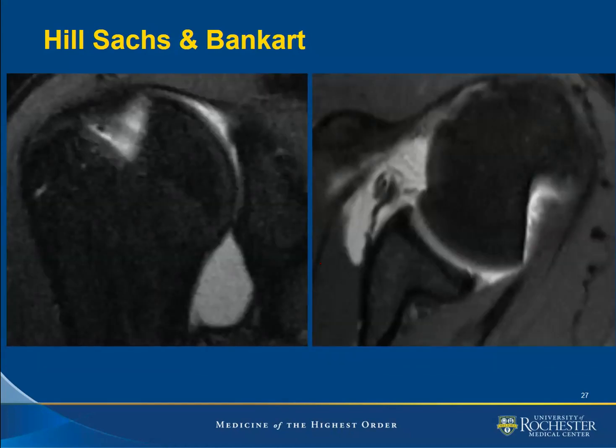Another case of a patient with a Hill-Sachs and Bankart abnormality, you can nicely see this on-track Hill-Sachs defect. And then when you get to that anterior inferior quadrant, you could see the stripping of the periosteum with tearing of the periosteum and complete displacement and tearing of the anterior inferior labrum, in this case with contrast getting between the periosteum and the displaced labral fragment.